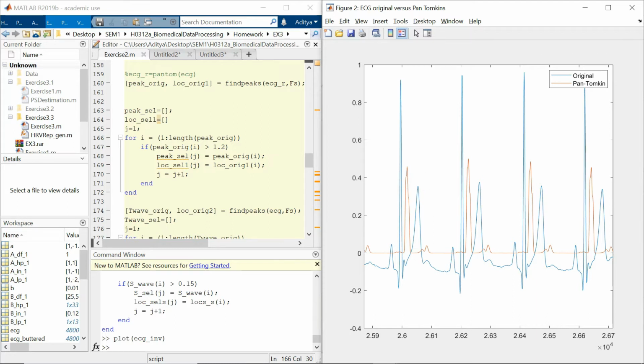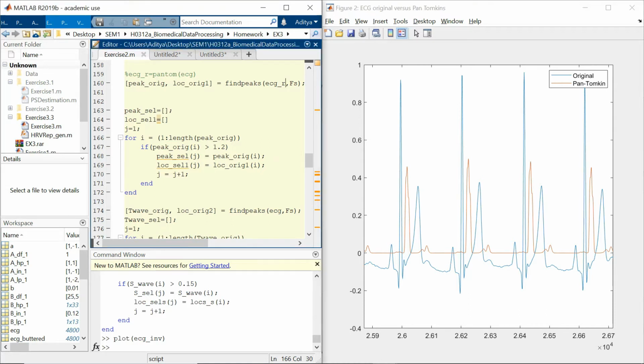then you can directly go ahead and find the peaks of your ECG signal. In that case, you just feed your ECG signal to the find peaks method for the same sampling frequency. So it will go ahead and calculate the peaks for every point of this blue curve that you can directly plot as the peaks of this curve and say that those are the R points.